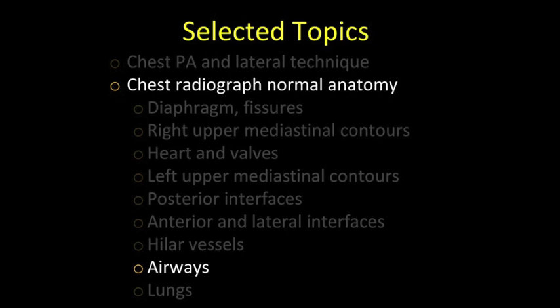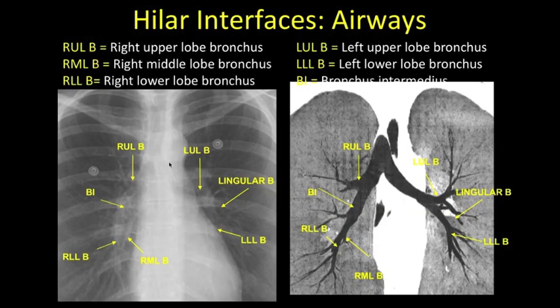So let's talk about airways. The trachea can be seen on chest radiograph and gives rise to right mainstem and left mainstem bronchi. The left mainstem bronchus is longer, the right shorter. The left is curved and the right tends to lead to a very horizontal right upper lobe bronchus. Bronchus intermedius can oftentimes be seen on X-ray, and the lower lobe and middle lobe bronchi oftentimes overlap on the frontal radiograph. The left upper lobe bronchus arises from the left mainstem bronchus, and the lingular airways and the left upper lobe proper airways arise from that.